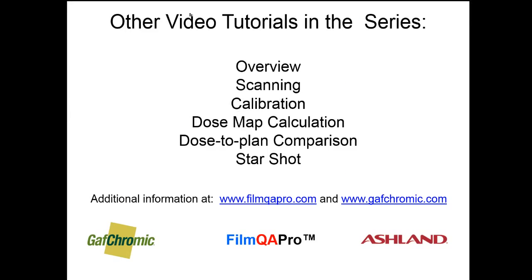That concludes this short-form tutorial on using FilmQAPro to measure a dose distribution for comparison to plan. You've got the basics. But as with your Microsoft Office applications, there's a lot more capability to discover if you explore. Other video tutorials in this series give a more in-depth treatment of scanning, calibration, dose map calculation, and the dose-to-plan comparison.